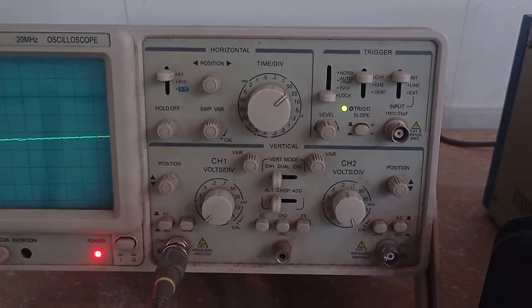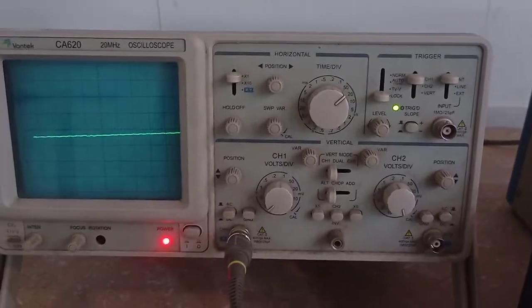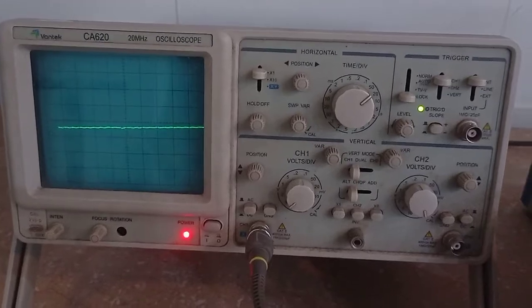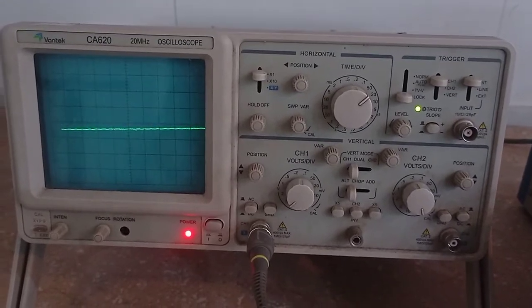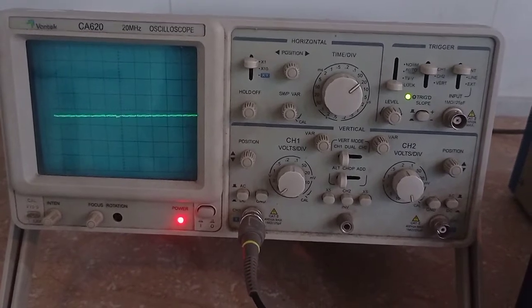And if you can see all the other parameters, you can clearly see these now, and you can replicate this experiment and try for yourself, and you can also try to see the waveform of any TENS or any electric stimulation that you use. I hope you like this video.